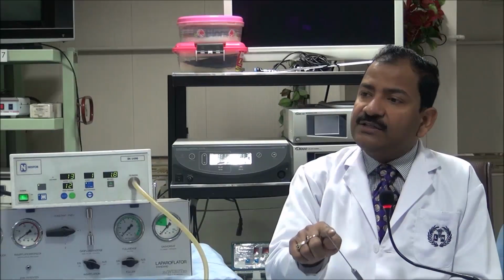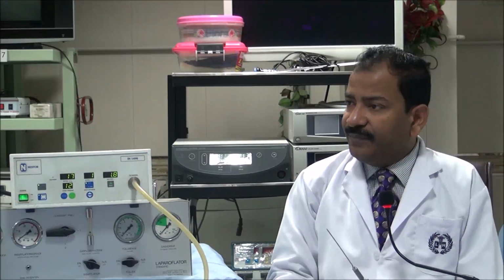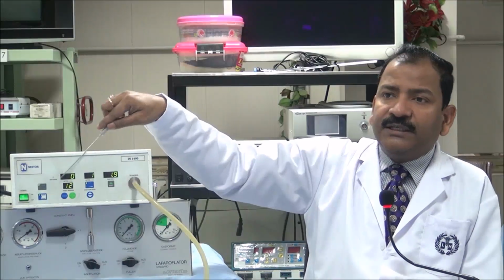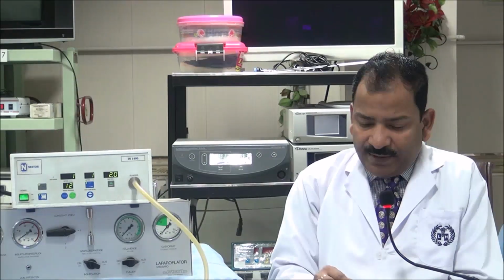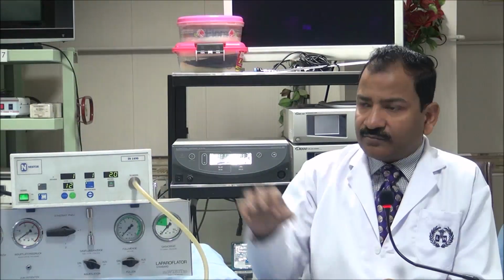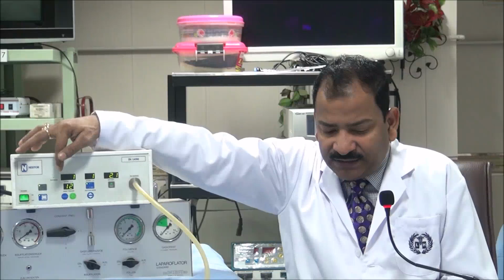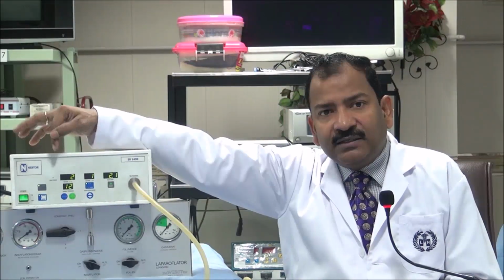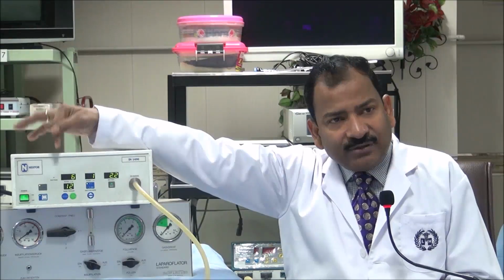And why is this increased reading given? Because of the resistance of the eye of the Veress needle. If I remove the Veress needle, it will become 0. There is no error. Why is it 0? No pressure, because it is going into free space. And suppose I am in the abdominal cavity, initially it will remain 0 and then it will rise slowly. 2, 4, 8, 6. Can you see that? Yes, it's rising. There is no error.